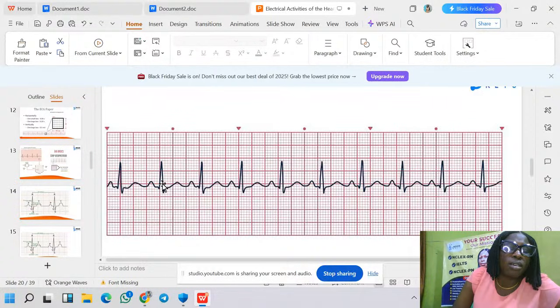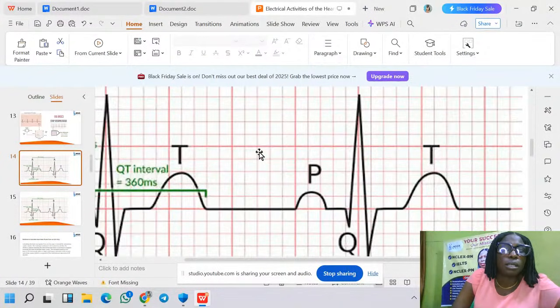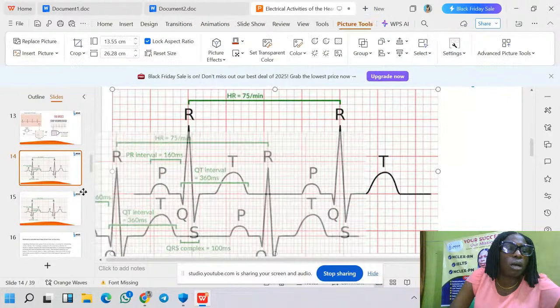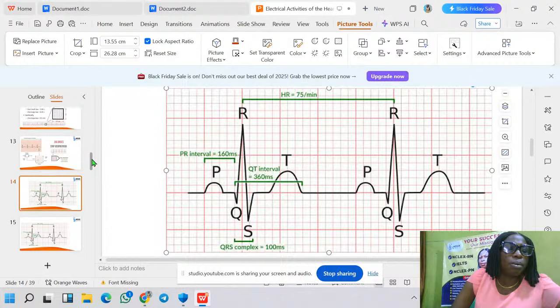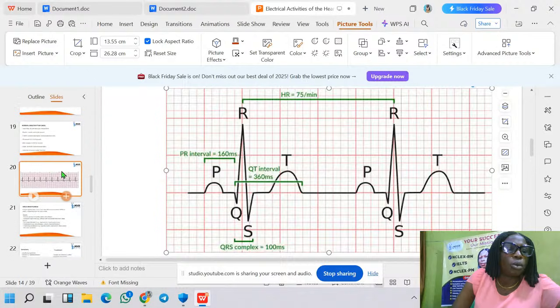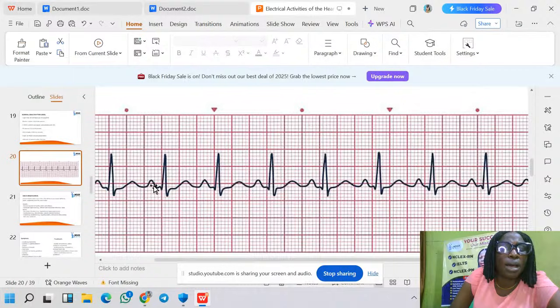See the P wave. You can zoom it at your end as long as you can see my cursor. See the P wave here, occupying two boxes within the range. The PR, see where PR is, I showed us earlier. This is occupying 4 boxes, which is normal. But in the image I'm using, the PR is just occupying 3 boxes, which is also not abnormal.